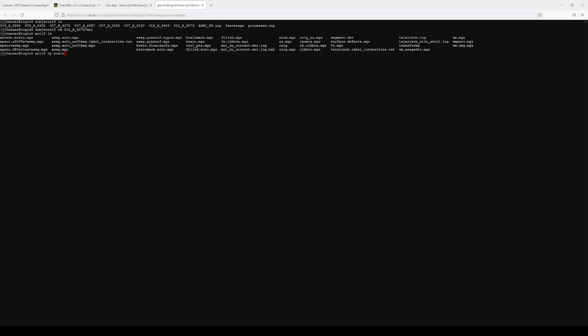So again, this is just being slow. So I'm going to pause and copy brainmask.mgz, and then I'm going to send it up a couple levels. So up one level, I am in a directory called MRI. Up one level would be in that subjects directory, but I want to put it up one more. So up two levels.